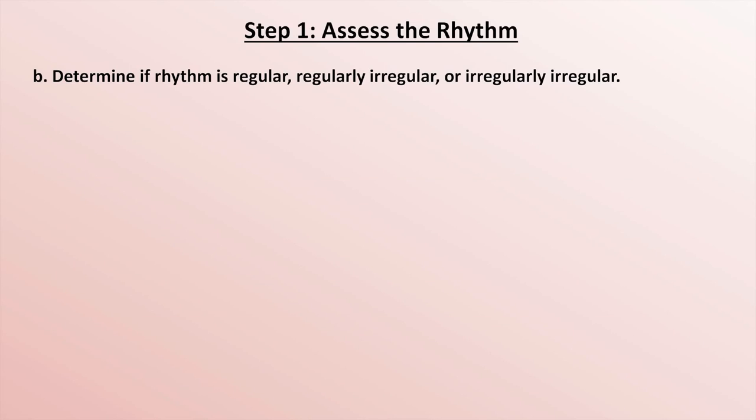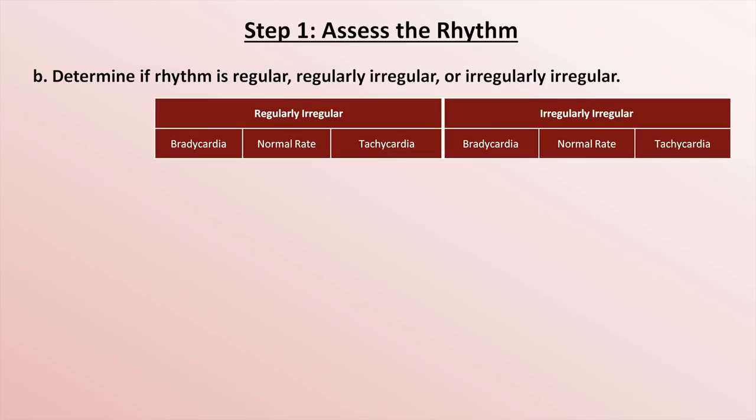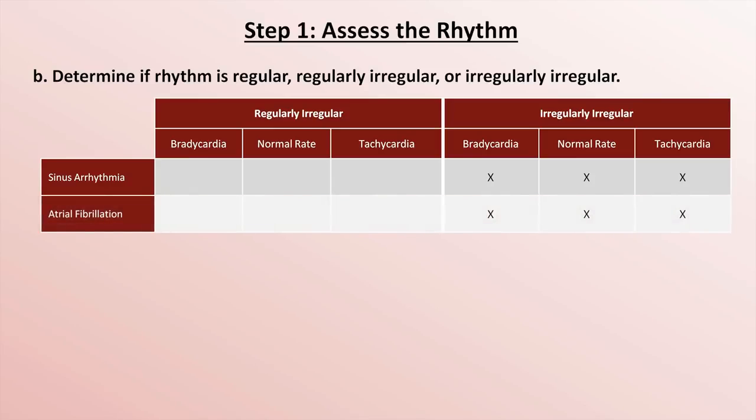Excluding those which are exceedingly rare, there are essentially 7 different irregular rhythms. I am not going to review these individually in significant detail here, as they will be the topics of additional forthcoming videos. Sinus arrhythmia, in which P waves are originating from the sinus node, but just at irregular intervals, often from primary sinus node dysfunction, can cause an irregularly irregular rhythm that can be slow, fast, or at a normal rate. Atrial fibrillation is the classic cause of an irregularly irregular rhythm.